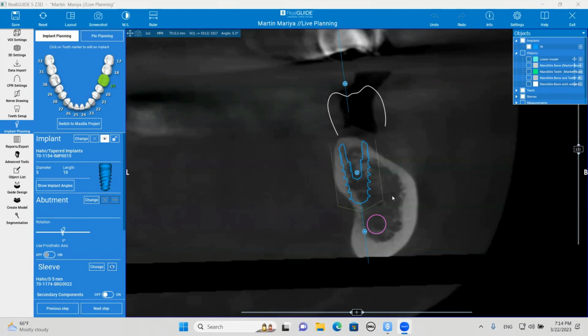And if you perforate into that space and possibly traumatize that artery, then you can end up with a sublingual bleed, which ends up as floor of the mouth swelling, lingual hematoma, and then you have a real significant problem. So the second problem with putting a 10mm implant in is when you drill into that cortical plate on the lingual, usually it will deflect the drill a little bit. So you don't have much margin of error on this case at all. This is pretty compromised bone.